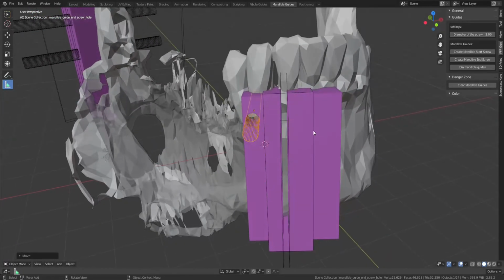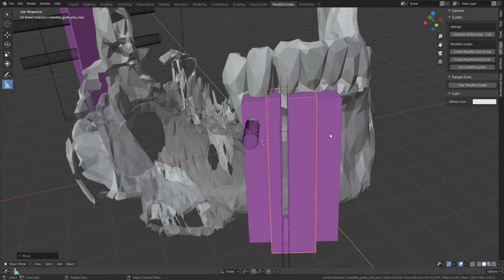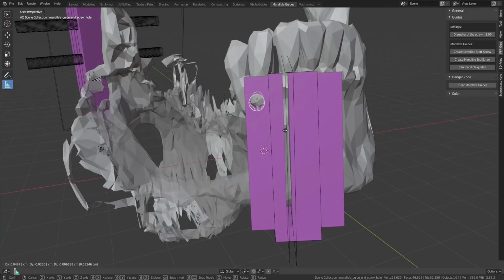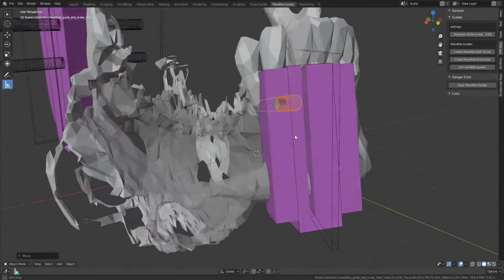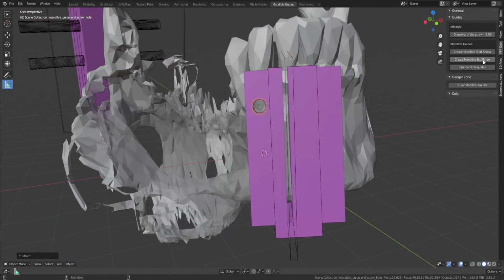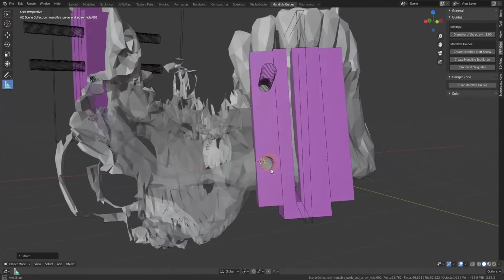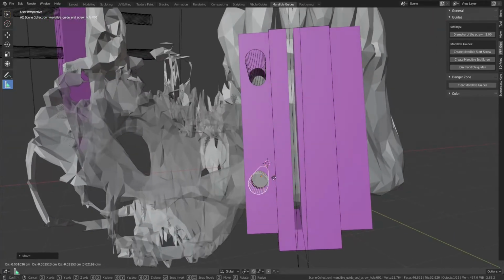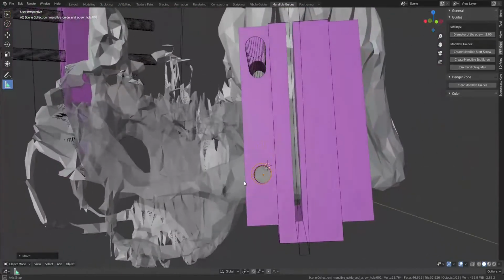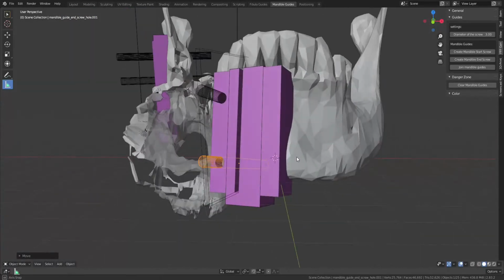It's a little bit too thin. Let's move this a little bit here and then move the guide. Okay, and let's put one more over here just in case the surgeons don't need to use screws, they can use some kind of clamps also, so I see that also.